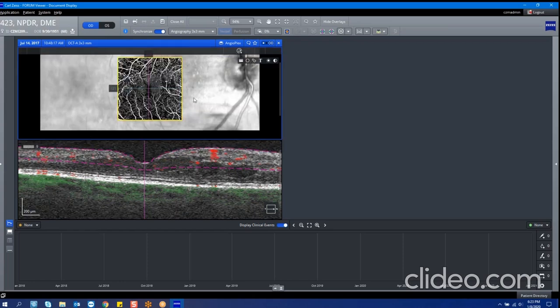Going to remove this from the list so you can see one more time how to register. So again, this is a patient with OCTA and a fundus photo. It could be done on your Claris. It could be done on any DICOM compatible camera. You would be able to overlay this, and it also does not have to be acquired on the same day.